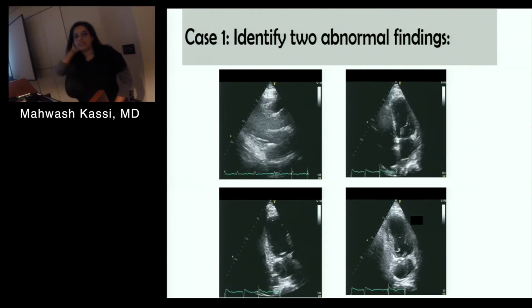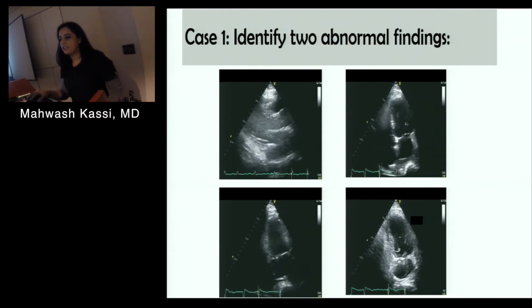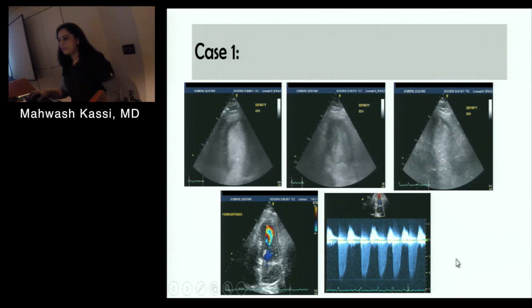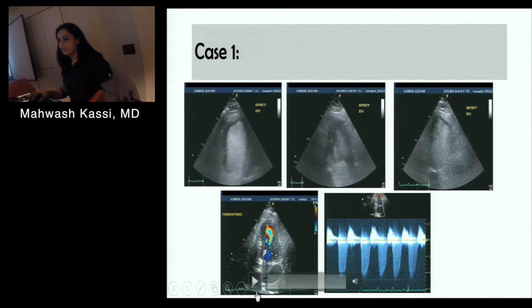Yeah, one of the abnormalities is that the inferior wall doesn't move very well, and I have a Definity image. I can show you that. That's a 4-chamber, a 2-chamber view. Here you can clearly see that the inferior wall doesn't come in as nicely. This is a 3-chamber view here too. So the inferolateral walls seem to not move very nicely.